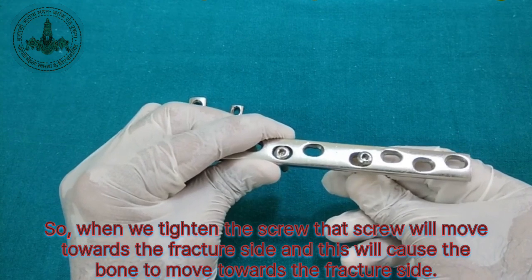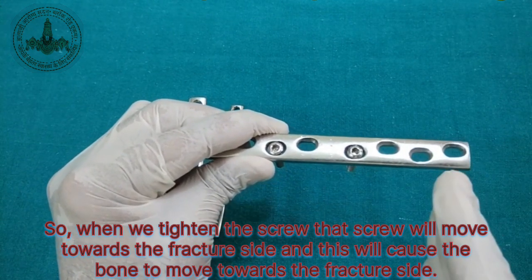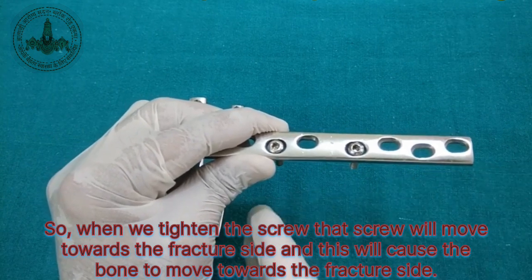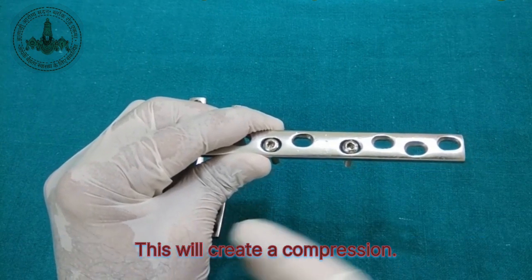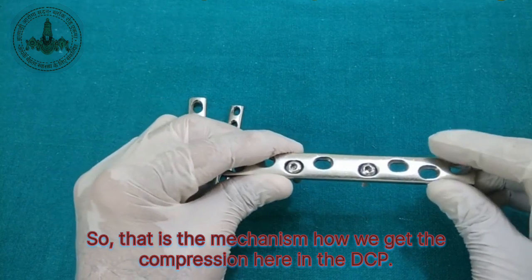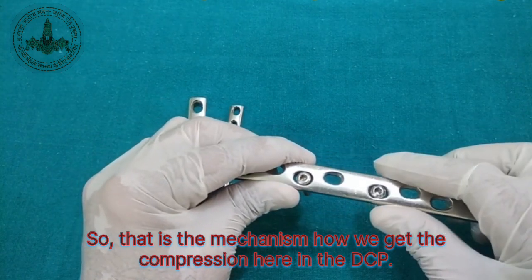So when we tighten, the screw will move towards the fracture site, and this will cause the bone to move towards the fracture site, and this will create a compression. So that is the mechanism of how we get the compression in the DCP.